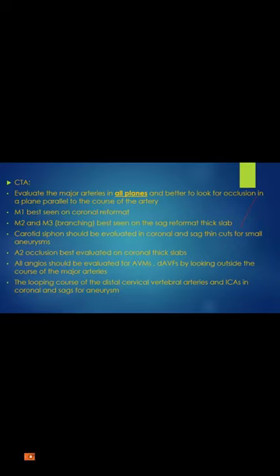Most of the time, it's a head and neck angiogram, starting from the arch of the aorta up to the vertex. And when we do that, definitely the head and neck don't have only vessels. There are other structures. So you need to make sure that you don't miss other structures or other structural abnormalities. There is a big list of things that can be missed in the CT angiogram if you just focus on the angiogram. And make sure to look at all the vessels in all planes.